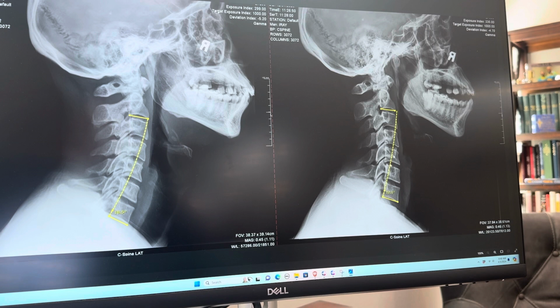And if you look at this film, you'll see this is more than just a junky cervical spine. We have some misalignment issues going on in here. We have some structure that's not optimal. And as this is coming over into this new film, you'll see that the alignment is actually moving into a better place. You'll see that this curve is reconstituting itself. It's changing. And what's happening for this specific patient is that the neurological issues are decreasing, right?